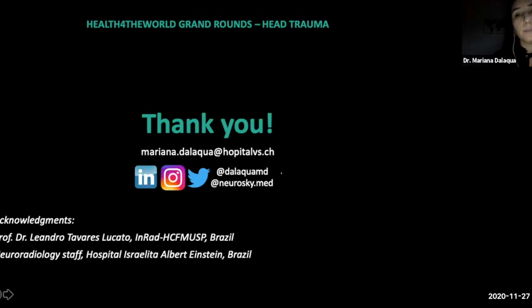Okay. So if you see hyperdensity in the cerebral sulci, is it ever a question of subarachnoid hemorrhage versus a traumatic parenchymal hemorrhage? Sometimes it's very difficult to say. In most cases, it's a subarachnoid hemorrhage if it has the same morphology of the sulci, but sometimes you may have very superficial cortical injuries that could simulate a subarachnoid hemorrhage. But if I'm not sure, what I do is to say we have just a cortical hemorrhage. And afterwards, in a follow-up exam or in an MRI, you're going to be sure what it is.